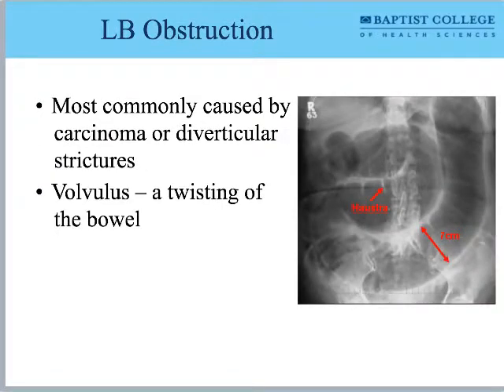For large bowel obstructions, these are most commonly caused by a carcinoma or a diverticular stricture, or possibly by a volvulus, which is a twisting of the bowel. And in this case, we have a large bowel obstruction.